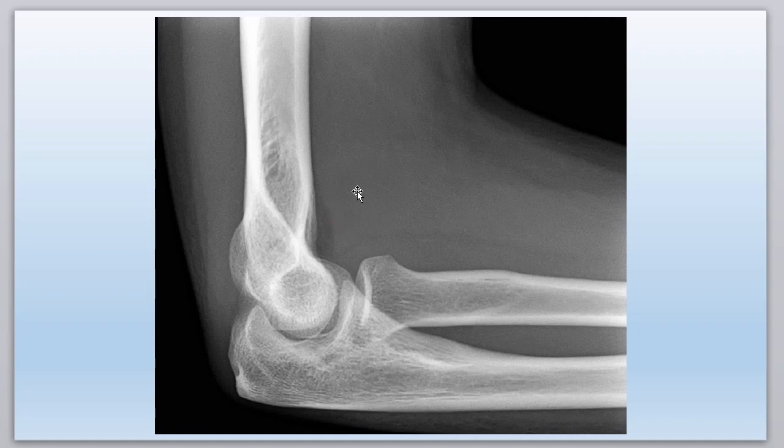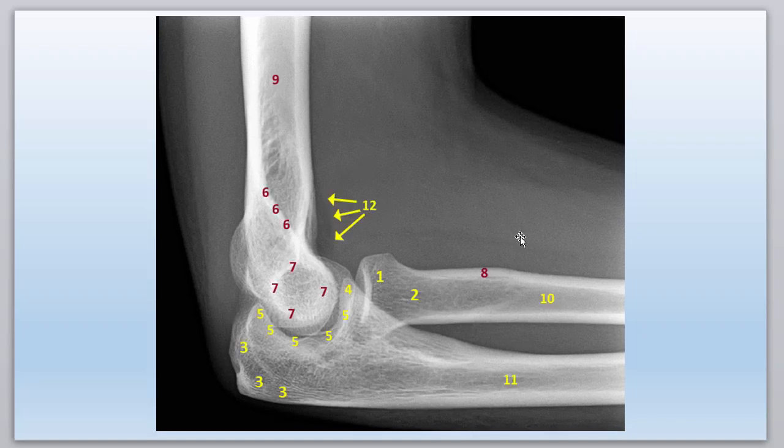I remember that number. It's a 90% chance there's a fracture. So you might even have to do a CT or even a bone scan if it's really elusive. Here's the numbers. Let's see if I got everything. So shaft of the humerus here. I have these labeled too.